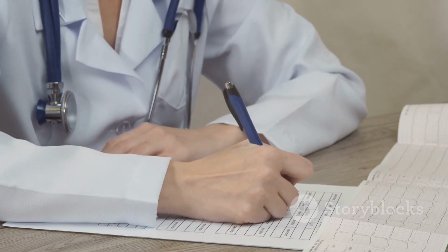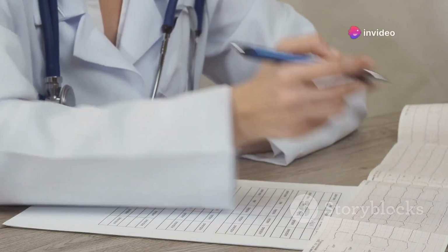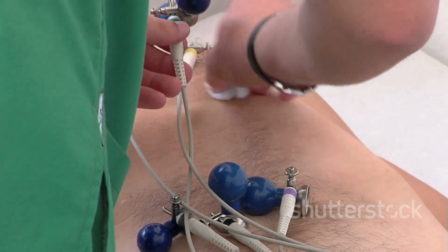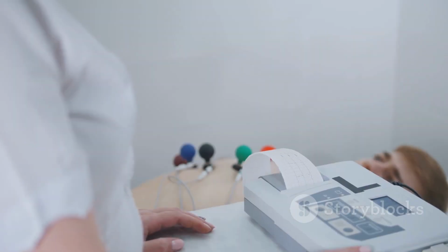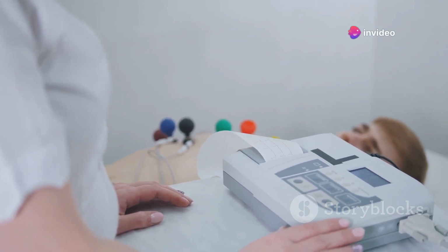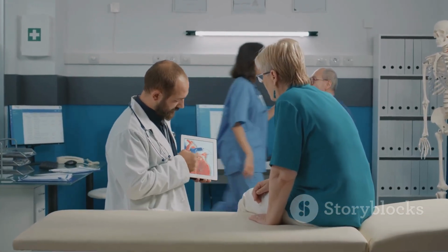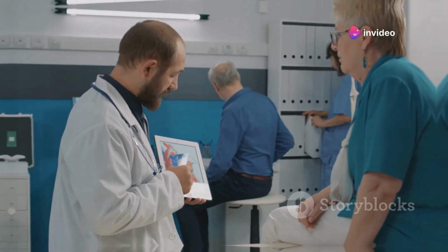Atrial enlargement, particularly left atrial enlargement, is commonly associated with conditions like hypertension and mitral valve disease. Ventricular hypertrophy, particularly left ventricular hypertrophy, is frequently seen in patients with long-standing hypertension. While the ECG can provide valuable clues about chamber enlargement, it is important to note that it is not a perfect tool for diagnosing these conditions. Early detection and treatment of underlying conditions that contribute to heart chamber enlargement are crucial to prevent heart failure and other complications.